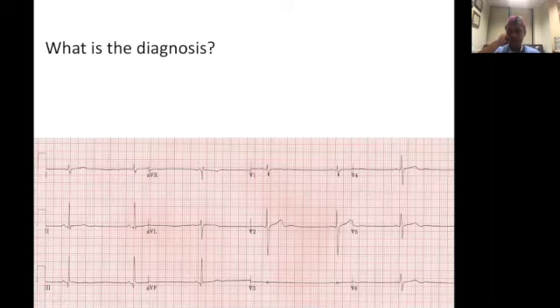I'm seeing a sinus bradycardia. Sinus bradycardia. Okay, you're telling me the diagnosis, but I want you to describe to me what is abnormal about sinus bradycardia, or how do you describe it in EKG terms? Because we're just looking at electrical activity and comparing from normal.